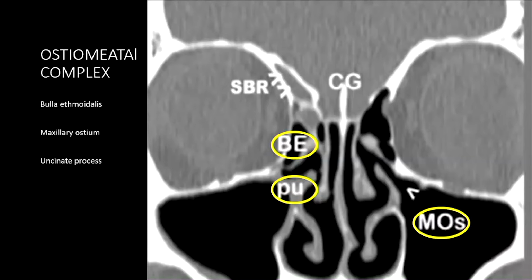symptoms. So the structures I'm talking about are the middle turbinate, which we all know about now, the uncinate process, and then this area is the ethmoid bulla. So that's like the middle ethmoidal air cells. It's where most of the ethmoidal air cells are. And on the other side, that's also the uncinate process. That would be where the maxillary sinus drains, ethmoid sinus drains, and so on.